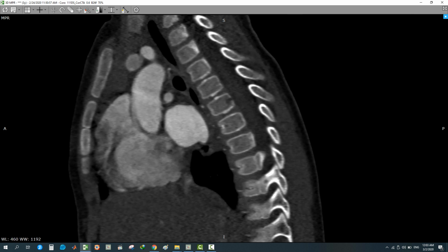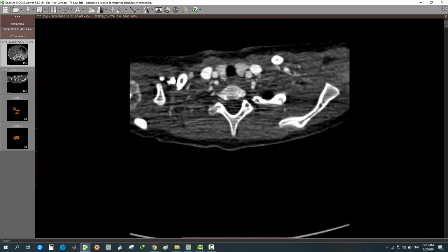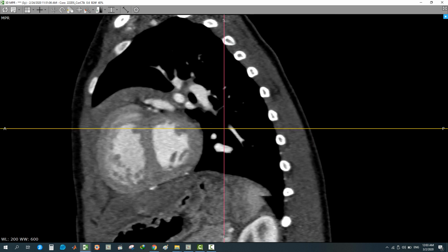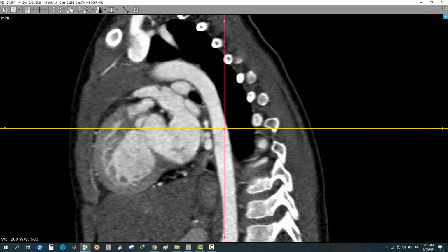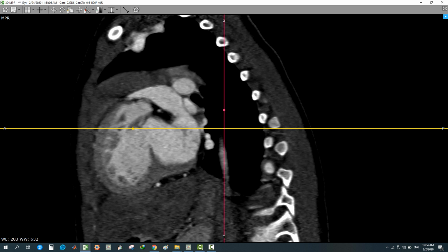Then I go to systole again to get the RVOT, and assess the RVOT in the sagittal plane, systolic phase. So I will choose the systolic phase and go to the sagittal plane like this. Okay, this is the left ventricle, right ventricle. This is the VSD, this is the aorta, aortic root, and this one represents the RVOT, the right ventricular outflow tract.